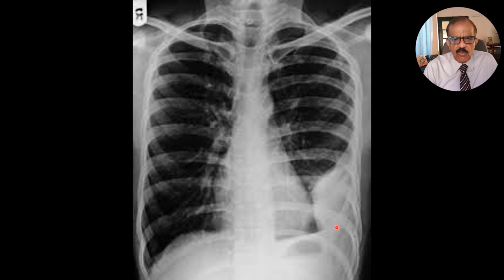This one is when effusion is encysted against the chest wall. This X-ray may not be of great quality, but you see this opacity. This is actually pleura. It is lifted off from the chest wall, goes this way, and then comes down. So this is fluid which is encysted and attached to the chest wall. This could be tuberculosis, or a complication of pneumonia or empyema, which we can find out from the history. But on X-ray, this appears to be an encysted effusion against the left chest wall.